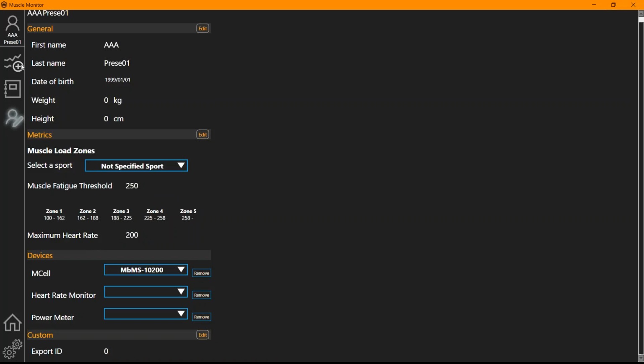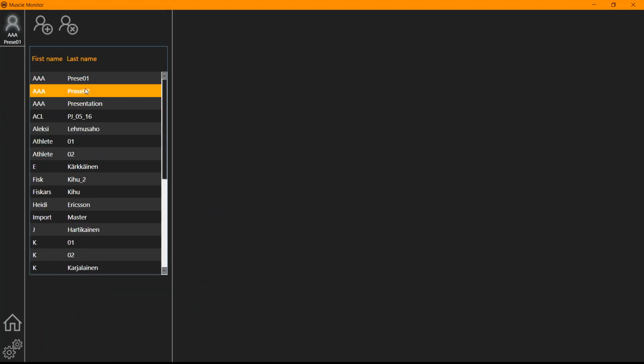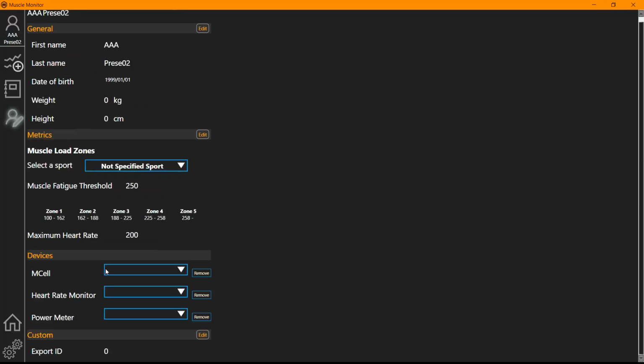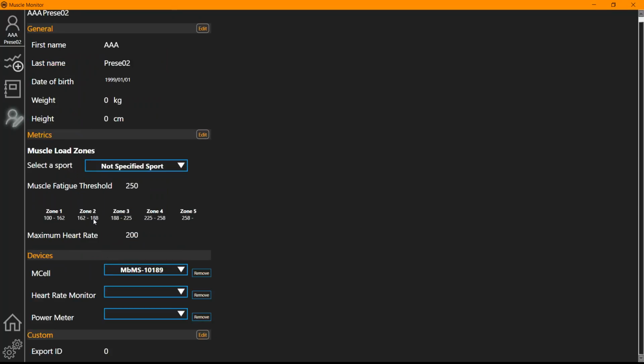Okay. And actually, because I will be showing you the multiplayer feature, we can make one more trainee. I'll give it a similar name, select it, and now I'll give this another device. Okay.